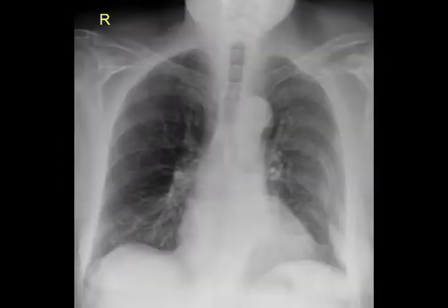Now we arrive to the D in disability evaluation of the chest x-ray. We're checking for any bony pathology, beginning by tracing along each posterior rib horizontally on both sides of the chest, noting any potential fractures or any other abnormality such as a punch-out lesion or lucency.